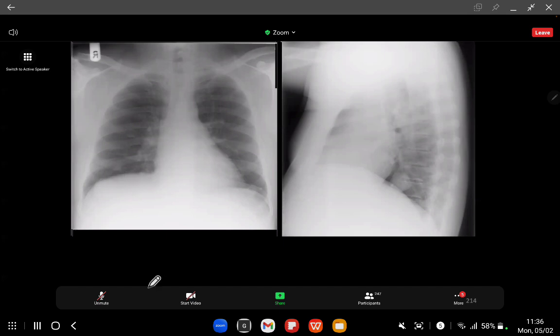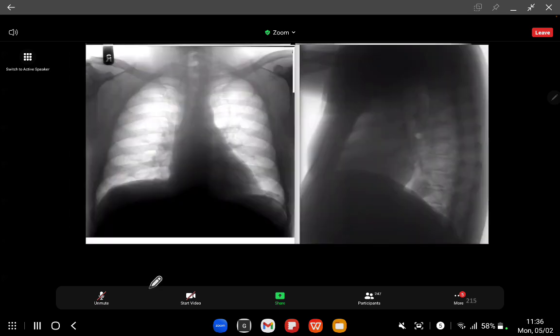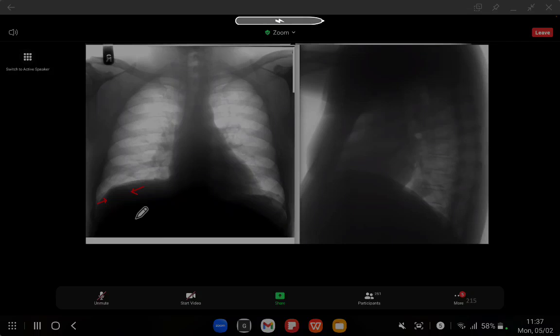And sometimes you may need to invert the image. And inverting the image, I think you can see it's a bit easier to discern the lesion. And if that makes you more likely to pick the lesion up, you must do it. So use everything you've got in your toolbox to pick up the lesion.